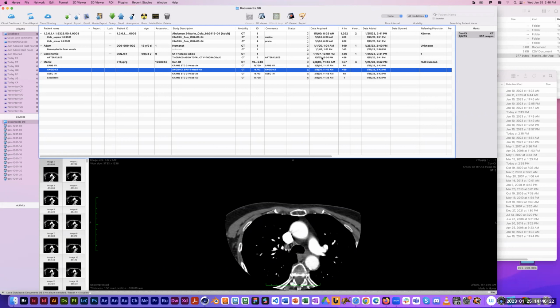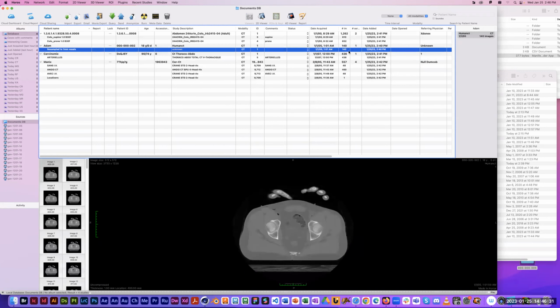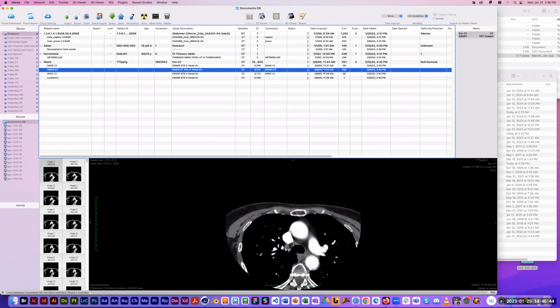Some of these, here's one with 436. The visible human male is only 140, so that's kind of low res. There's one with 652. So I'll always look at that number of images and try to pick one with a lot of images. So I'm going to go ahead and pick this angio CT. So probably CT angiography. So there is contrast fluid in the vessels, and it's got a lot of images, 460, which is a good number.